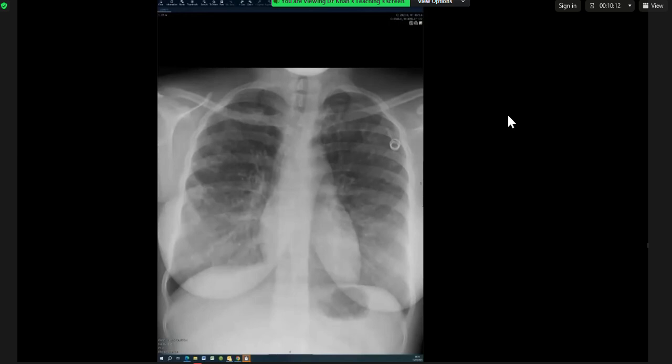In summary, this is a patient who has a portacath with bilateral cystic bronchiectasis and a focal opacity in the right mid-zone peripherally, and a suspected further opacity in the right lower zone. I would think about cystic fibrosis in the first instance, and with the cavitating opacity, I would be worried about atypical infections.